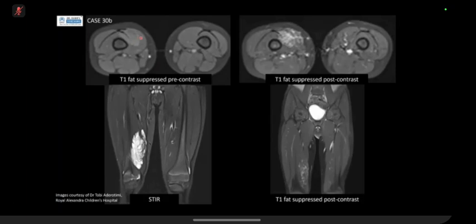And MR just shows you, so these are the post-contrast and pre-contrast pictures showing just cystic spaces or cystic signal ill-defined lesions, but they just look quite bubbly. And in post-contrast, depending on how delayed you acquire these images, you can get enhancement within them. Okay, this is more on a difficult spectrum, but it's just to complete. If we're talking about hemangiomas, then we need to talk about the vascular malformations as well, but it's unlikely to come out in exams.